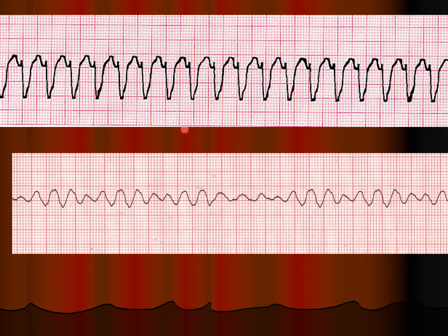All right. Uh-oh. So they're fat. No matter what you say, we've got wide QRSs here, and it looks regular. So we got junk in the trunk. We have a regular rhythm, and it looks pretty darn fast. So we have VTAC, ventricular tachycardia. See how nice and cookie cutter that is? I don't want this on my patient, but for diagnostic purposes, it's easy to tell.